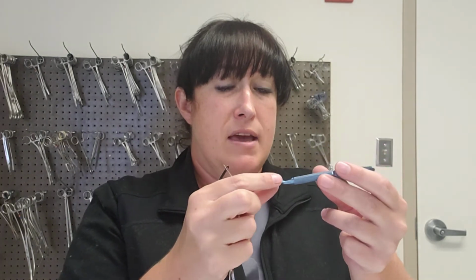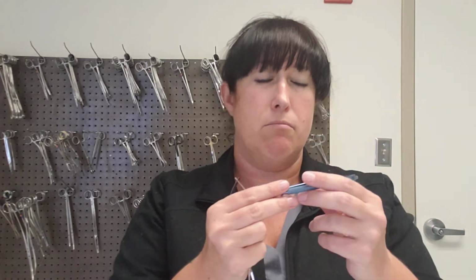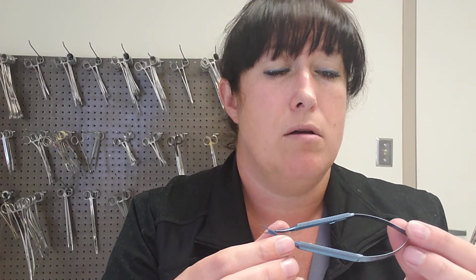And it is ideal to use this titanium. This is the blue. I know it's mentioned in your book. But this titanium is strong, but it's also lightweight. And it's dull too. In the microscope, there's going to be a light that has to shine in there, and if you've got a super shiny instrument, that's going to make it really difficult for the surgeon to see. But with this titanium, it's a little duller, and it's not going to shine as much as a really shiny stainless steel.